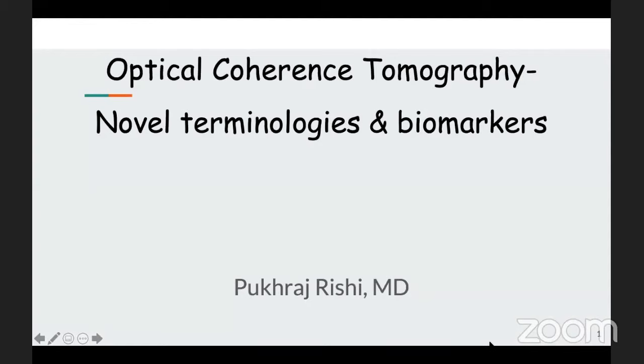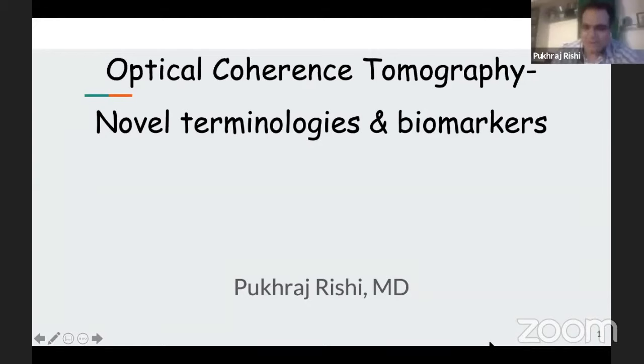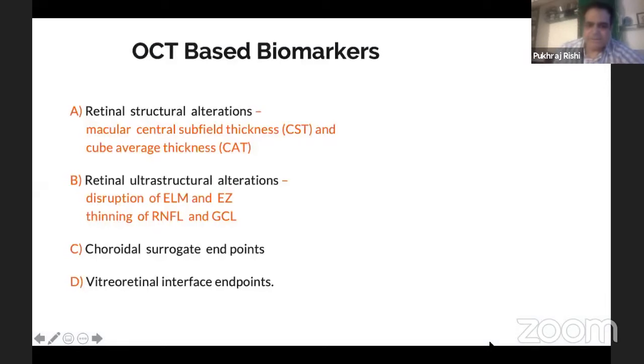Okay. So, I'll be speaking on novel terminologies and biomarkers in OCT. So, some of the terms are often used. Basically I'll be using some very basic terminologies and touching on some newer ones. So the biomarkers which are OCT based can either be quantitative or qualitative.